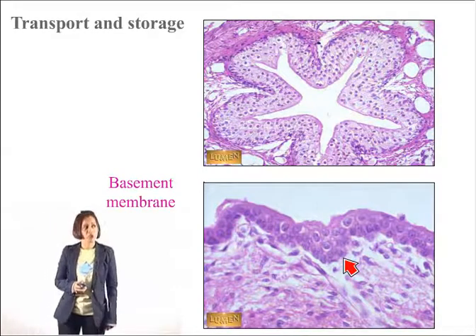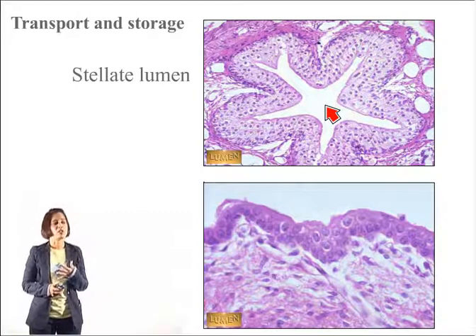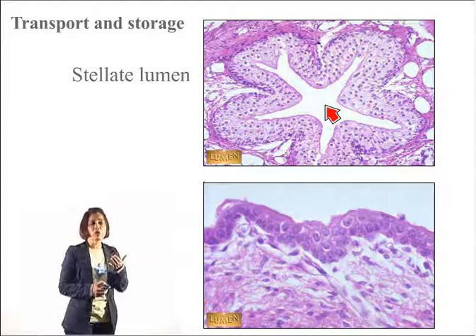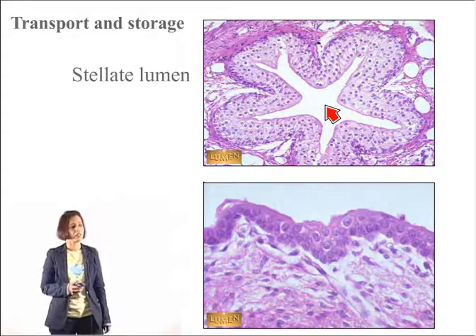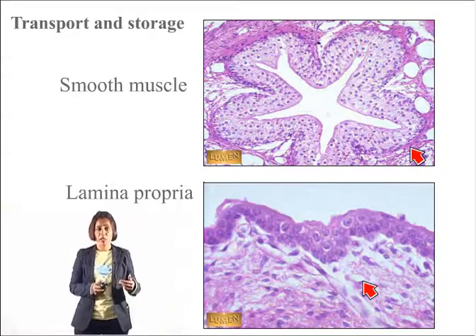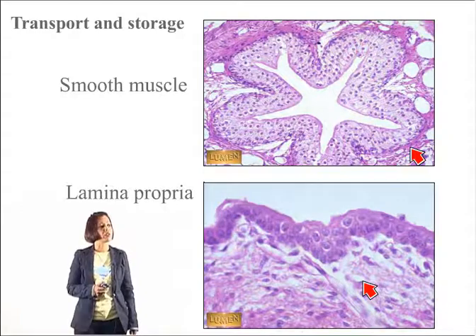In the ureter, what you see is a stellate lumen, because the ureter is a very, very muscular organ. It tends to throw the lumen into folds, and sometimes you'll see a very narrow lumen. In fact, in this image you are looking at a fairly good sized lumen. And then the arrow is now pointing to the smooth muscle in the top. Again, like I said, the ureter is a very muscular organ which has a very thick smooth muscle layer.